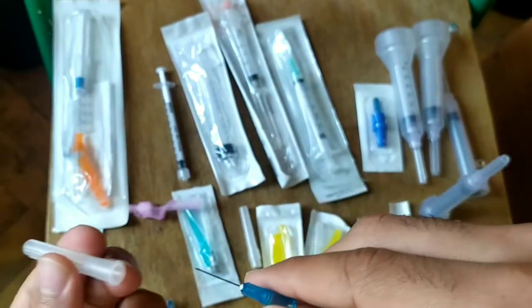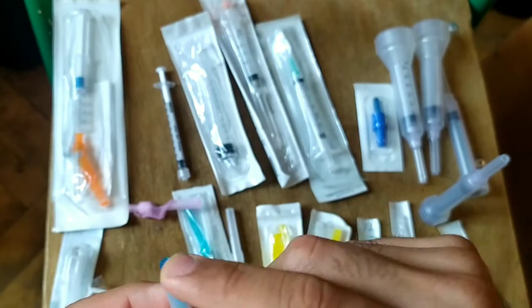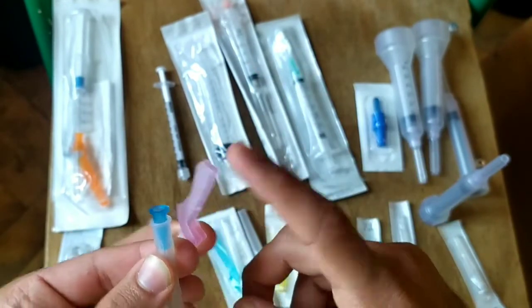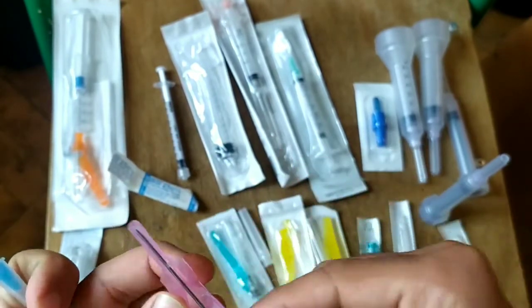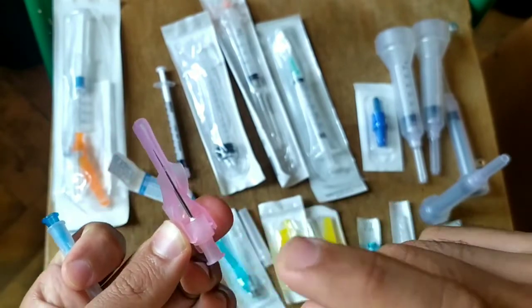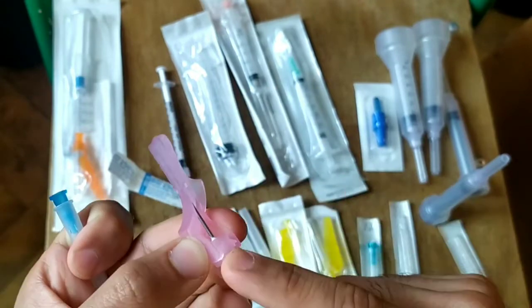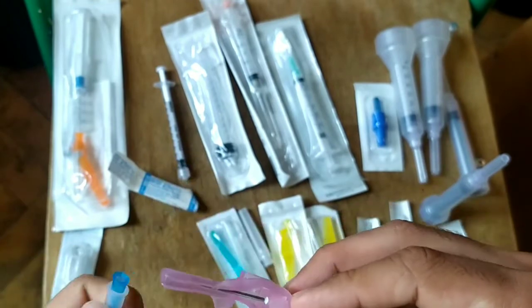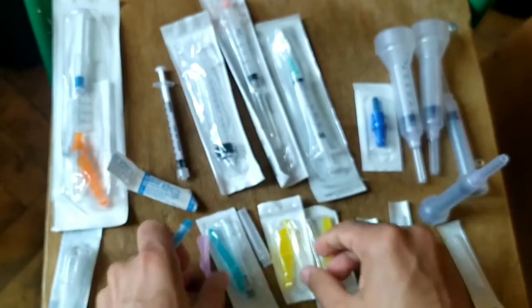Also one thing to be remembered is that these colors on these needles are not random colors. They are the universally accepted color coding of the needle. So an 18 gauge needle will have a pink cap everywhere this color coding is accepted. Yes, countries can have their own codes as well, but this is the universally accepted color code.